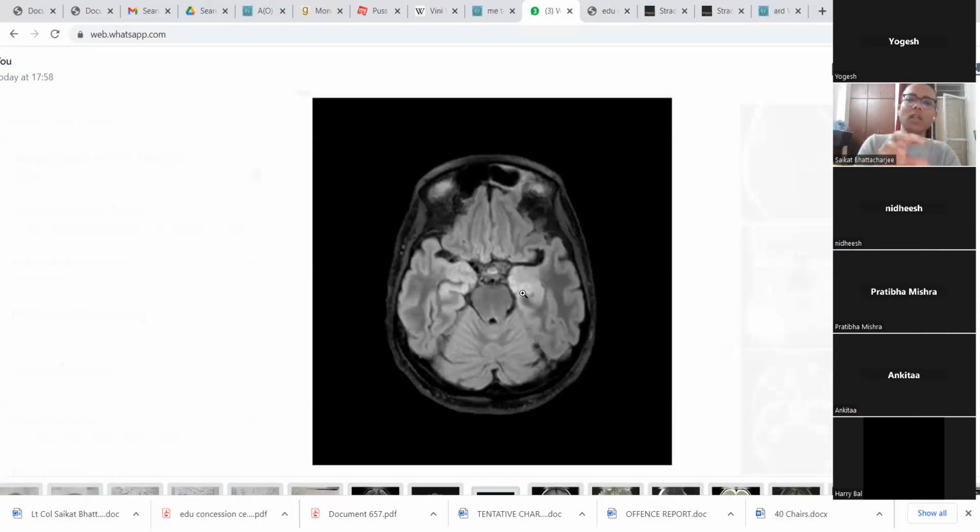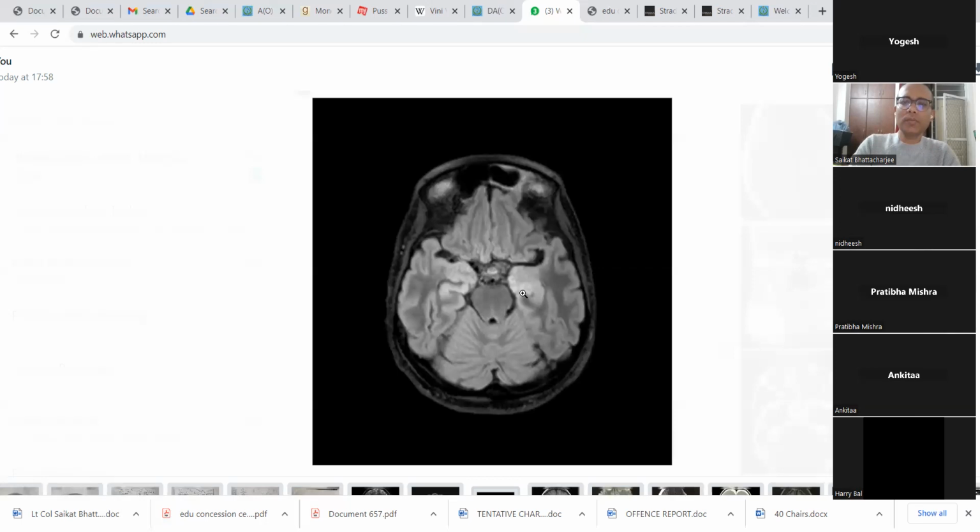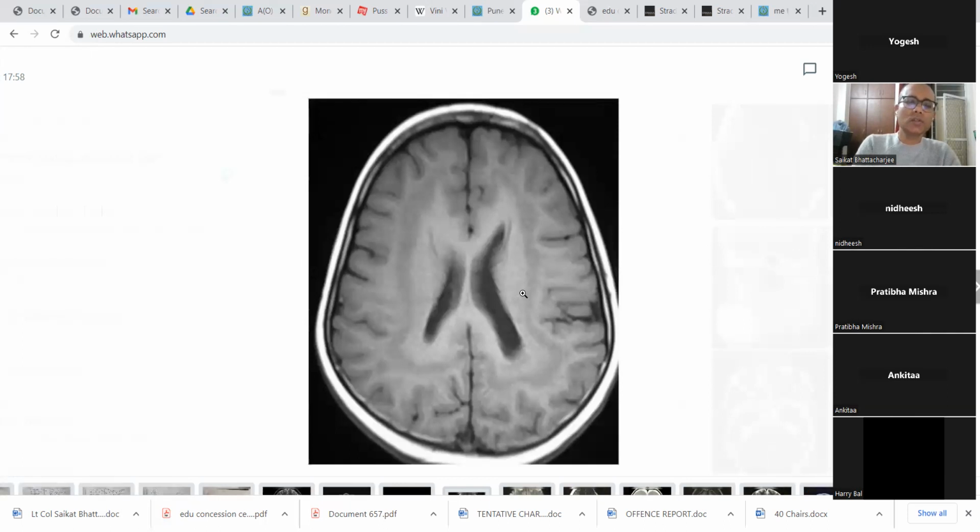But it should progress. Generally, the patient presents with fever and altered sensorium, and when you do imaging first, you see this, and then if followed up, it might spread along the limbic system also. Limbic encephalitis has other differentials as well, which you must look up, because imaging in encephalitis might be a clinical scenario which you might get in the examination. This patient will present with fever and altered sensorium and maybe seizure also.